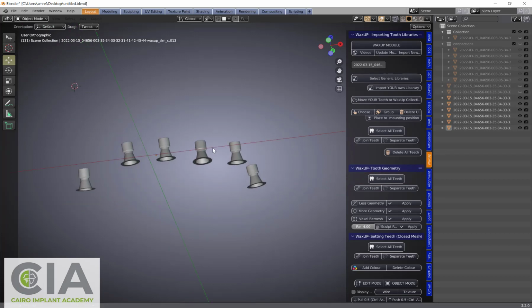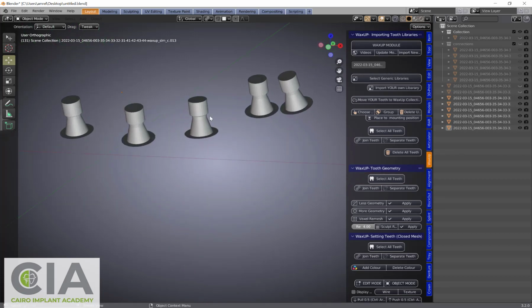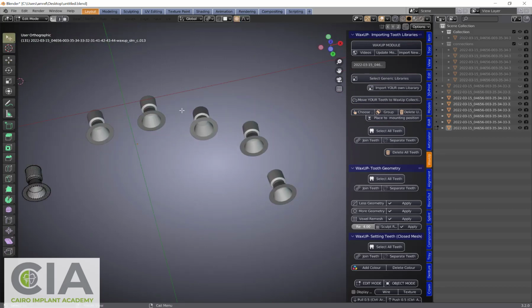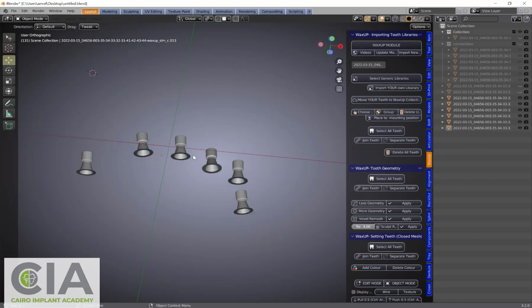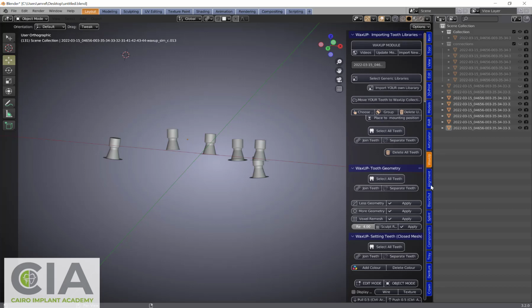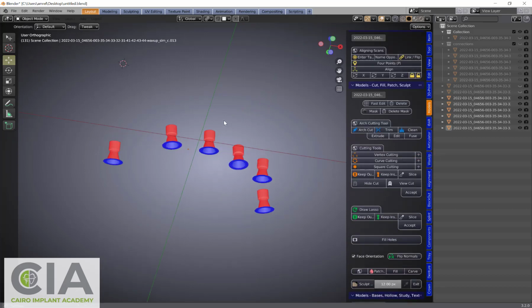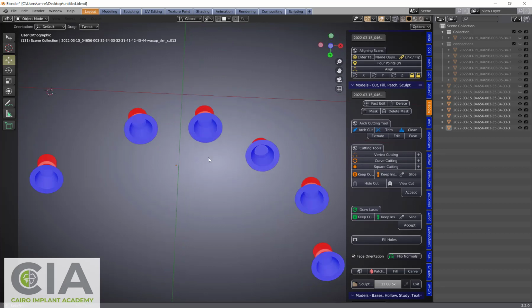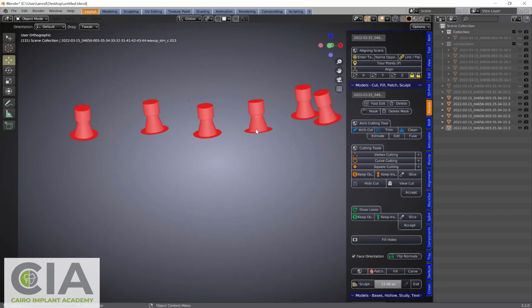When we finish doing this, we will have those nice 6 connections, as you can see here. They have very nice meshes. If you go to the edit mode, you can see they have a regular mesh, and when you look at the face orientation, this is very important. You have to make sure that the inner surface is the blue one, which means this is the positive, and the outer one is the red, because this will be the cutter for the new framework.